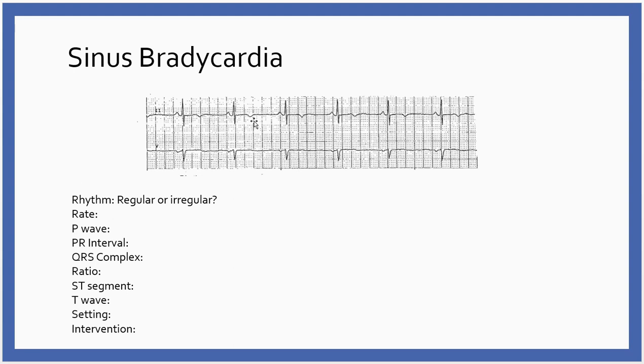And there's reasons to use different leads. For example, lead 2 is a great lead for looking at atrial issues. If I have a patient that has atrial fibrillation or atrial flutter, I want to look at lead 2. But if I'm concerned about ischemia, heart attack sorts of things, ventricular issues, then lead 2 is not the best. The V leads are the best because they tell me more about the ventricles. So that's why we oftentimes see more than one lead used when examining the heart.